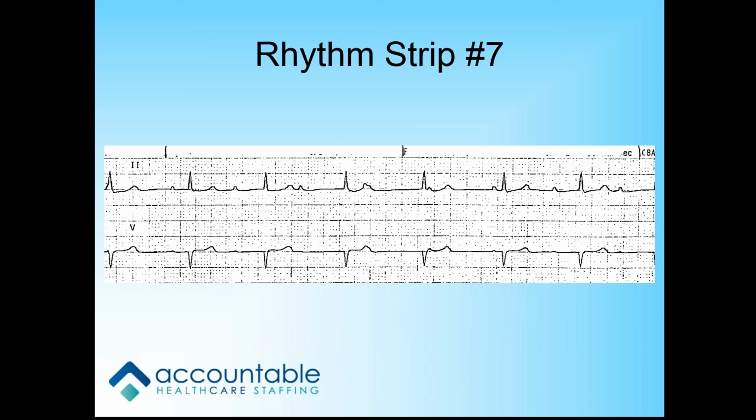Oh, great. Okay. Well, it's one of the ones that you were worried about. The heart blocks. Yes, it is one of the ones you were worried about. So let's break this down. When you're dealing with a heart block, your best thing to do is to take every one of those 5 steps and apply it diligently to the rhythm.